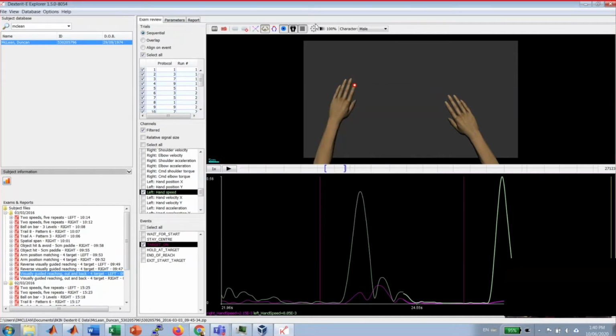Beyond that, there's some other tools up here that are worth mentioning. There's a caliper. You can just click and drag these calipers around. So if you wanted to do some verification on your task to make sure, were my targets as far apart as I thought they should be, you can use the little caliper tool and make sure everything measures the way you think it should. Or you can even do a bit of analysis with this and see, okay, how far did the person get perturbed when I used a 5 Newton force, and do some measurements. So if you need them to go further, you can determine that using something like this.